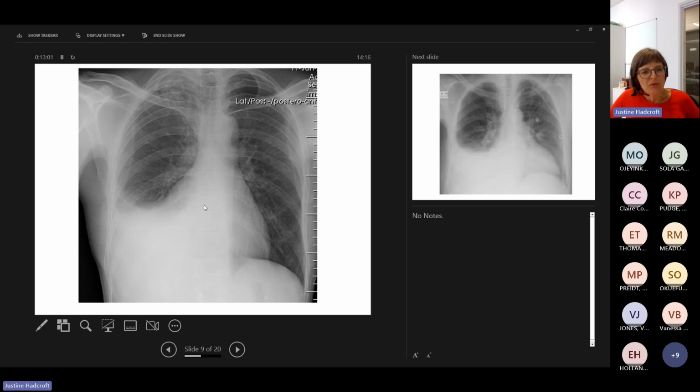And if you look at the shape of it, instead of being straight across like the previous ones, can you see that this is slightly arched here? So it's a little slightly rounded. It goes down and then it goes up again, up here as well. So this is what you typically see in a pleural effusion. So this would be a meniscus. If you've got any fluid against a surface, the fluid clings to the side of the surface and will form a meniscus. So this shape here is quite typical of fluid there. So this would look like a pleural effusion.